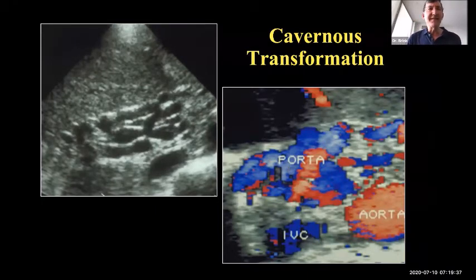I only highlight this case because this ligament, because it contains so many structures, we could spend a whole hour talking about all the conditions that you can see in the hepatoduodenal ligament, whether it be complex stone disease, such as Mirizzi syndrome, a cavernous transformation from portal venous obstruction, or other conditions that are related to these various structures.